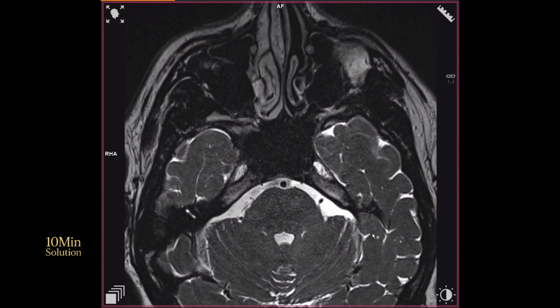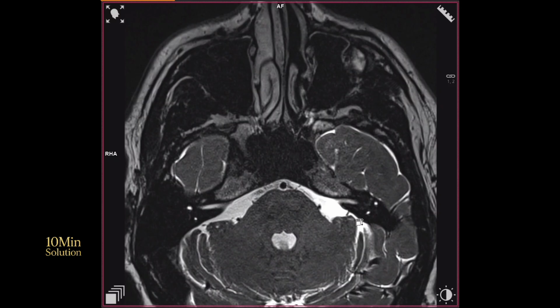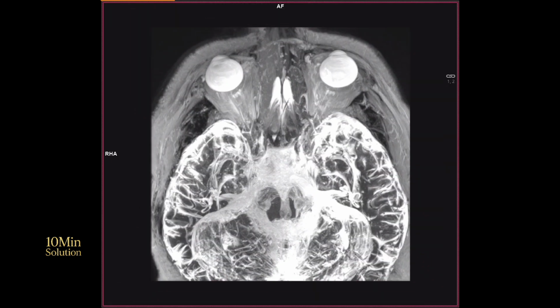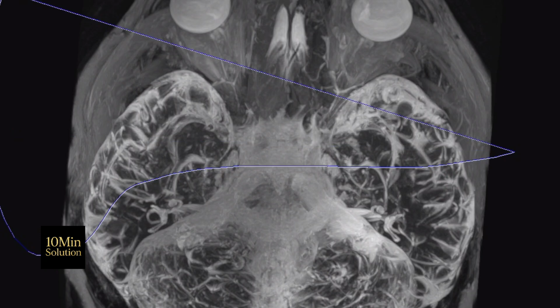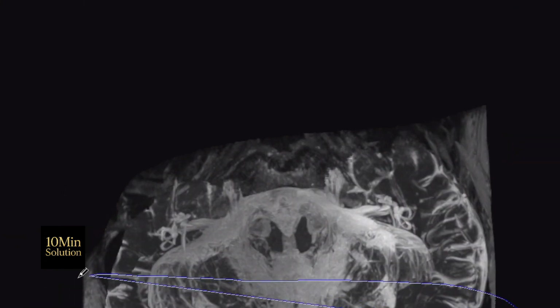Today's video is about the post-processing system of MRI of cochlea, an essential step for accurate evaluation of inner ear anatomy and pathology. Although cochlear imaging is performed using high-resolution sequences, proper post-processing is crucial to reach an accurate diagnosis.